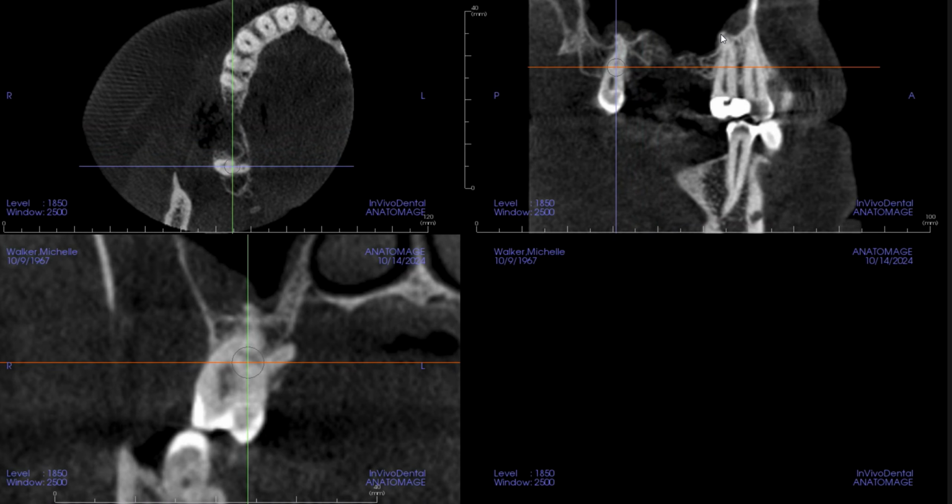So only now do I have a pretty good understanding of when to refer to the ENT. Without a question, when you see complete opacification of the sinus, that's a good indication that the patient should be referred. But when you see these small polyps, those are pretty inconsequential. If anything, you should refer to your dentist, which is us. All right, back to this.